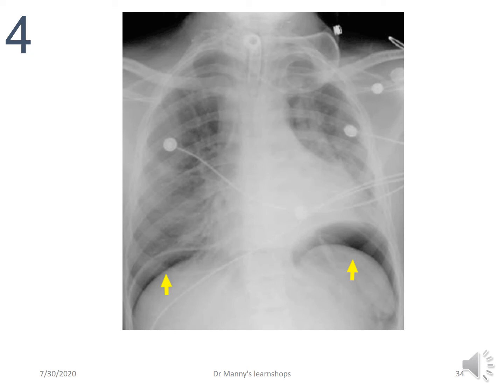Now you've got a lot of air bilaterally under the right hemidiaphragm and under the left hemidiaphragm, which is abnormal. Unless you've got a gas bubble, which again with a gas bubble you can see it is a bubble. There's no bubble here under the left or the right hemidiaphragm. This is an example of pneumoperitoneum.